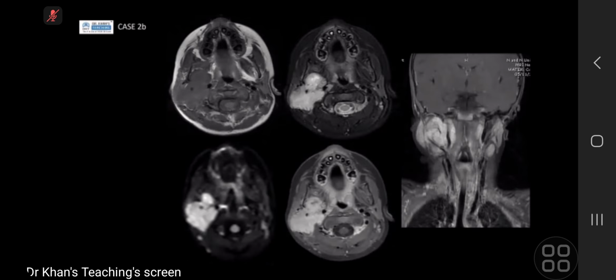However, this one on the other side, or salivary gland tumor. This one could be salivary, but I'm expecting this of the patient. So this patient is 5 years old. Okay. For 5 years old, I will exclude the neoplastic cause. I will go more with lymphoid hyperplasia or inflammatory causes, and this could be lymphadenopathy from this one.